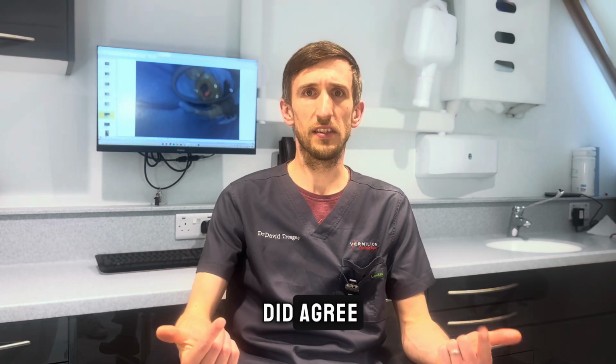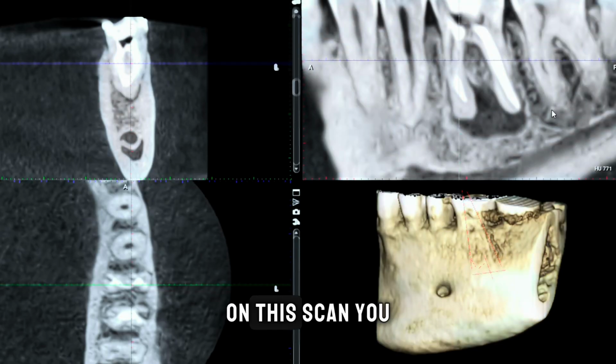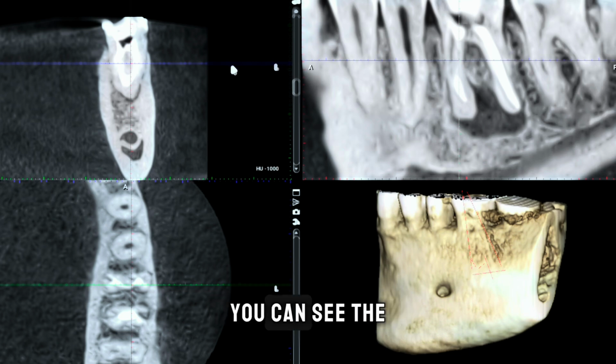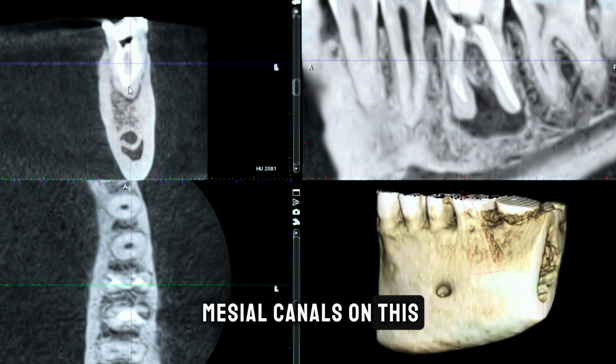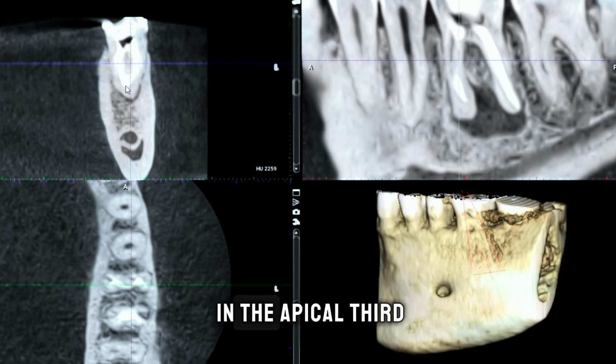At this point, we agreed, let's take a cone beam CT scan to try and work out the entire anatomy in that mesial canal system. On this scan, you can see the tooth that we were in the middle of root treating. You can see the mesial canals on this top left screen, and there are 2 canals here which join to one in the apical third.